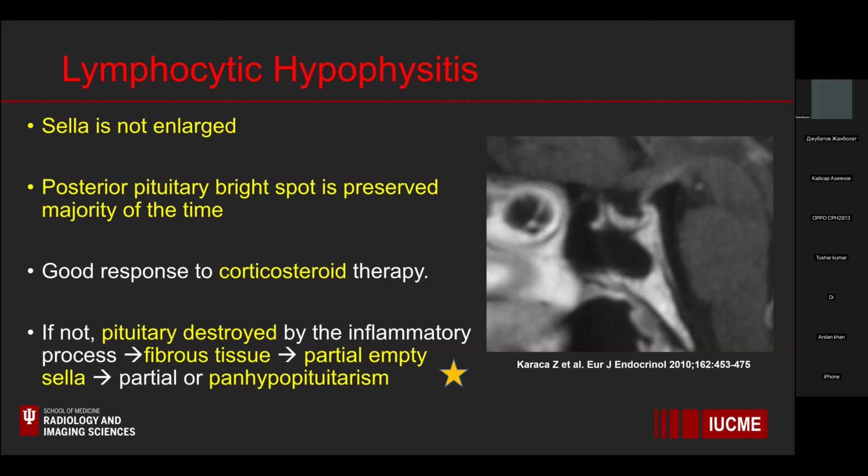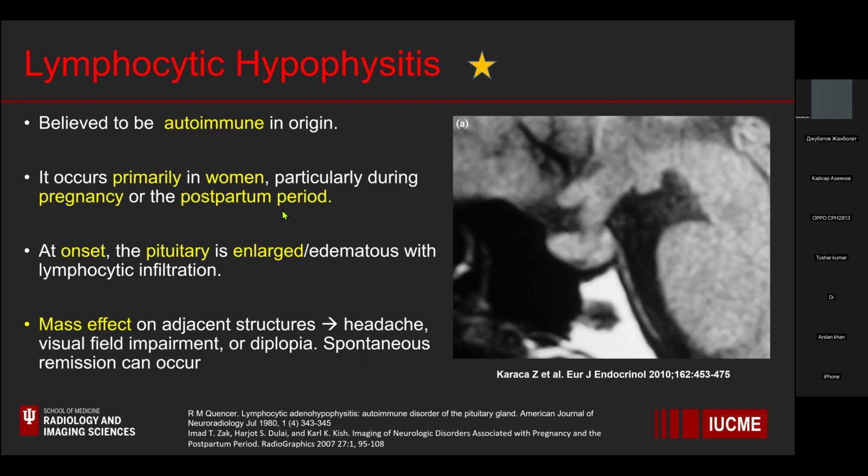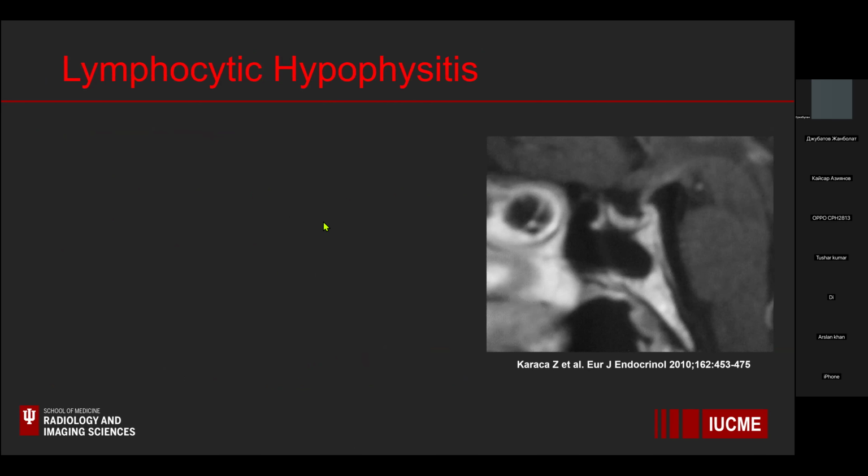So it's important to note this disease process, particularly in the patient population that I talked about, primarily women in the pregnancy and postpartum period. If you have that kind of patient and you see this imaging presentation, think of lymphocytic hypophysitis.